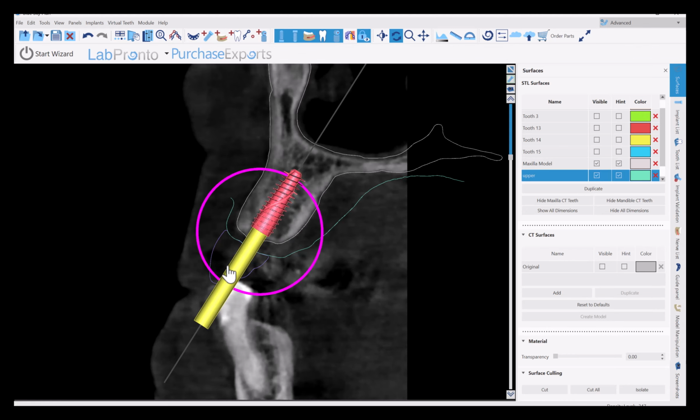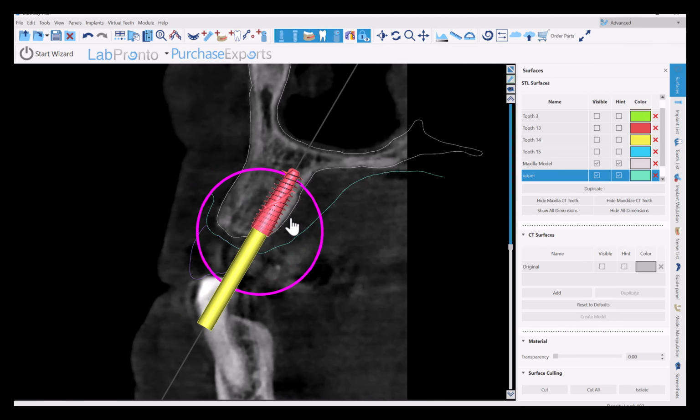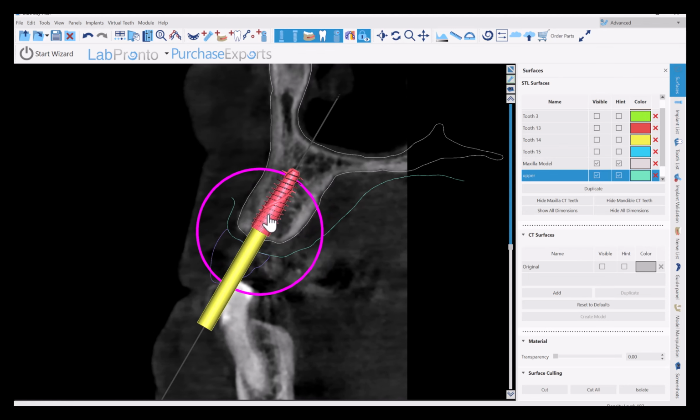So given this class 3, my position probably needs to be coming just lingual to that incisal edge, or right in the incisal edge. Because if anything, I imagine the incisal edge position is correct, and if we can get them back further eccentric, which I don't know yet, maybe this mandible will drop back some, but we don't want to come way lingual, and then have this big ledge on our restoration. So I'll go right there. At a minimum, that should be in the cingulum area of this.